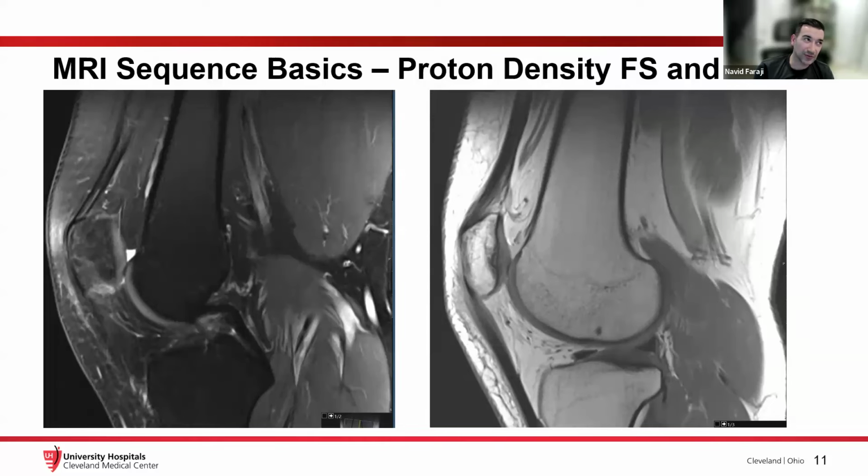So we can see the contrast in the joint and we can assess the labrum, but the arthrogram protocol is not going to be as good for tendinous pathology or anything like that. So if you're not sure that it's labrum or it's maybe more non-specific complaints, I would say probably non-arthrogram, regular 3T is the move. But if you're pretty sure it's labrum, yeah, 3T arthrogram is probably better than 1.5T arthrogram in that setting.